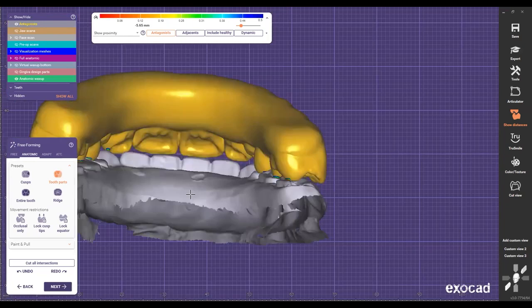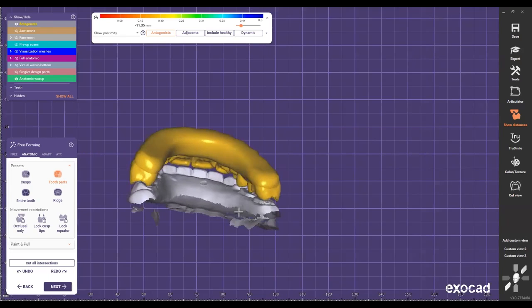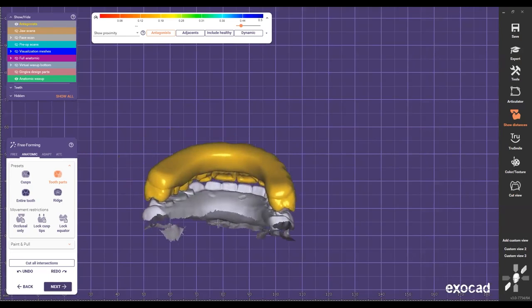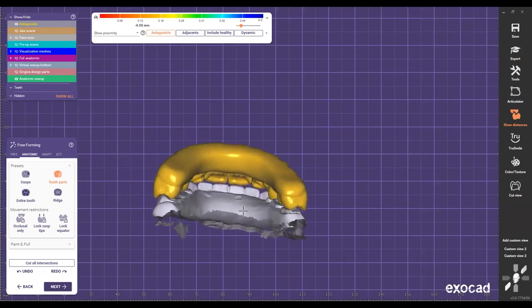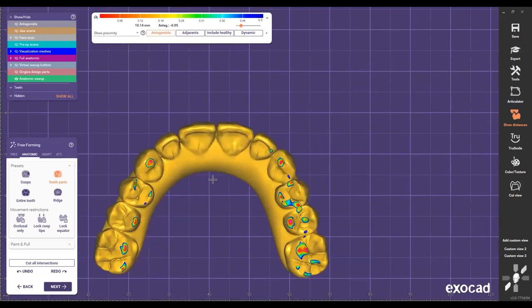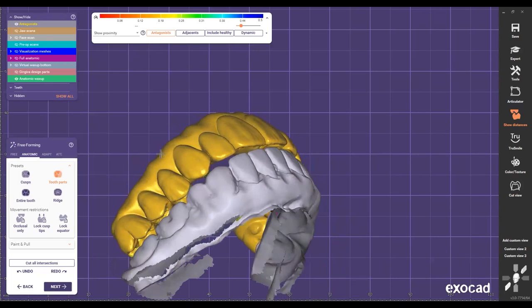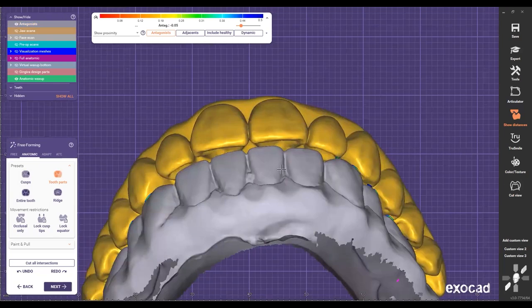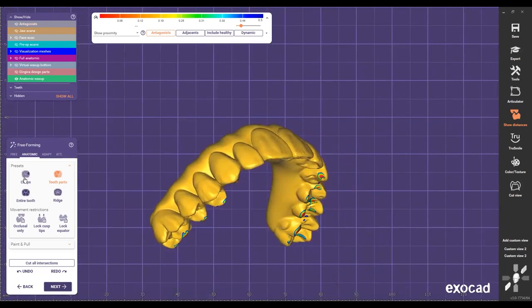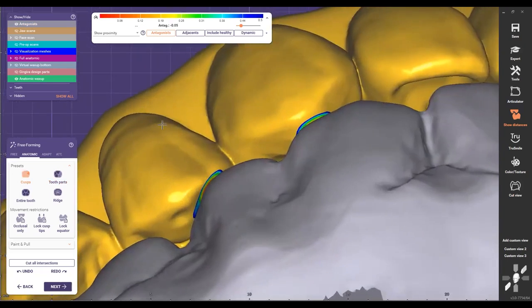Especially when I prefer to do double arches because of these things, right? It's not a big deal to have a single one, but you just need to know where to put the contact on the opposing if it's just a single arch. When it's double arch, no big deal, because everything is in occlusion, following everything, right? So once I do this, you have to communicate with the doctor. Say, hey, doc, anterior 7 to 10, lateral to lateral is going to be out of occlusion. And then my posteriors from canine to the first molar are going to be in occlusion.